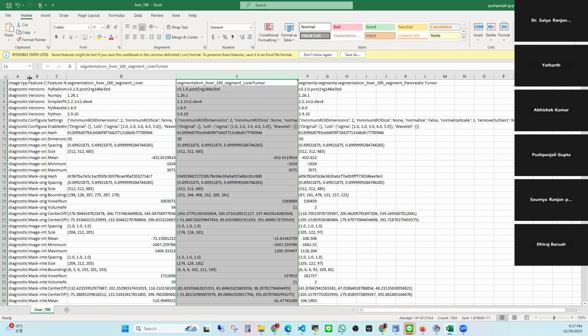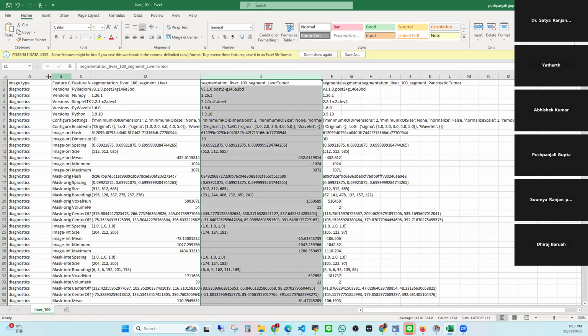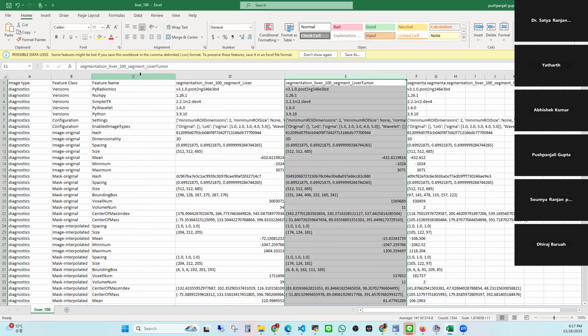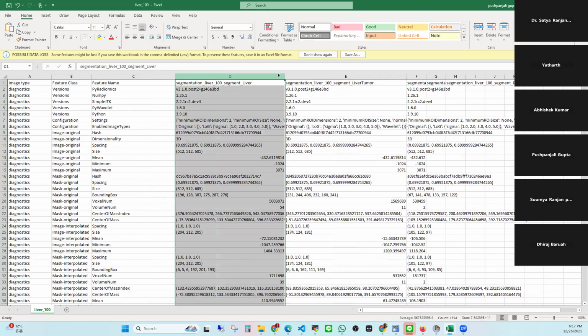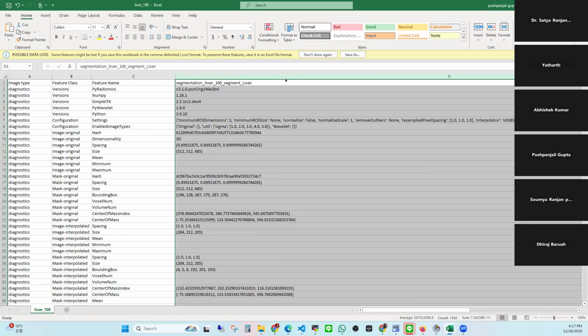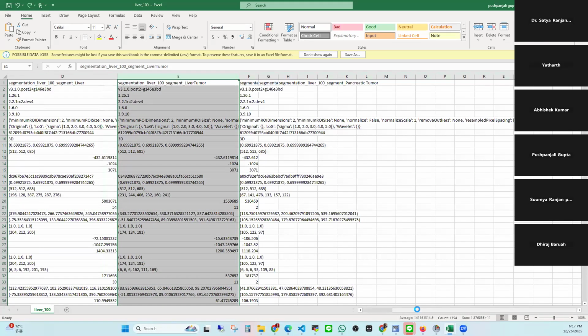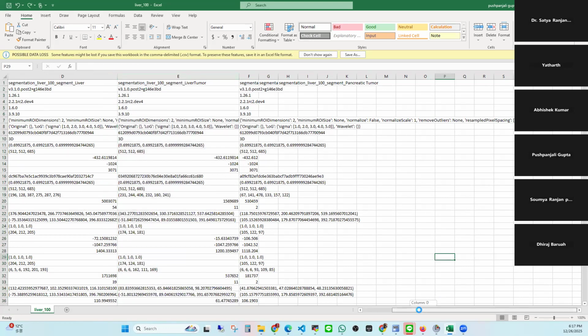And then we have different things, like if I show you the example over here, based on the theory we have read on this day. Okay, I think there is something. I think I just copied these things over here. Wait, exactly what happened.